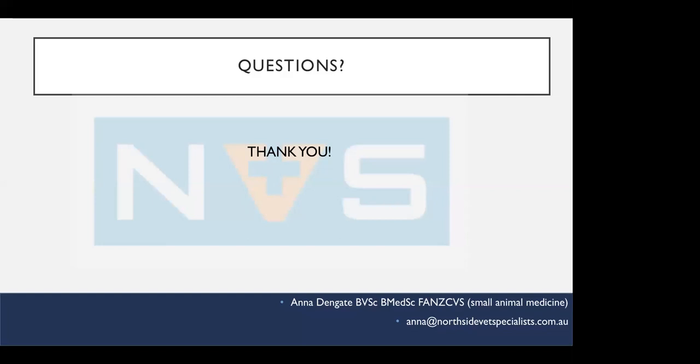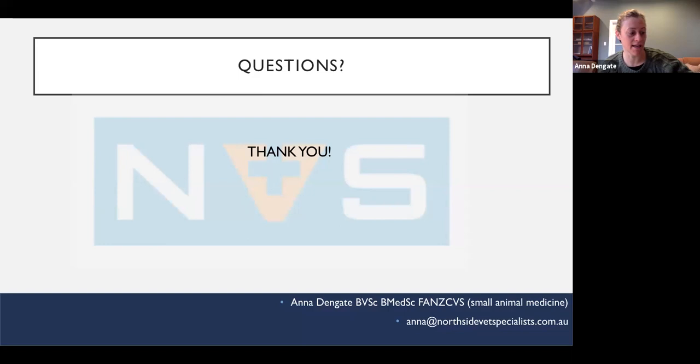I agree. That was good. Particularly those of you doing oral exams, it's really good to just have, I need to comment on size, anatomy, landmarks, echogenicity, echotexture. And you'll get all the marks if you cover that checklist.